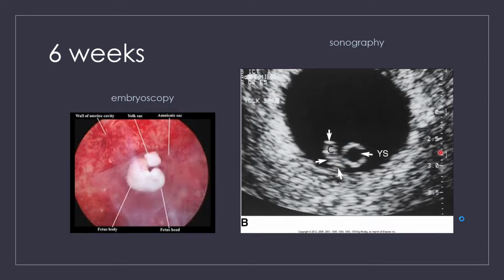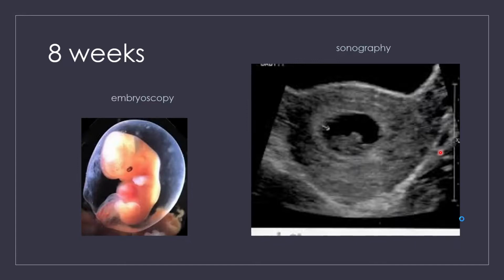We'll learn more about how we're going to identify these things and measure them, but I just like to give these few slides of introduction because it's just kind of cool. So here we can see that embryo, and then on ultrasound, this is what it looks like. Okay, it's just a tiny little shrimp in there. Sometimes they'll look like a little gummy bear around this time because they've got that big head and those tiny little arm and leg buds. And then we can see right here, this is just a normal gut development, and then we've got the heart back here.